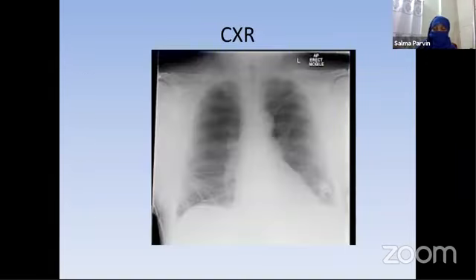and this is a film I think you don't like, because the total scenario is not very well known to us. There is haziness seen around, and multiple wires are running here and here. You know that this is not a very clean cut and clear chest radiography. But why are we here? Because critically ill patients need multiple wires around their bodies.